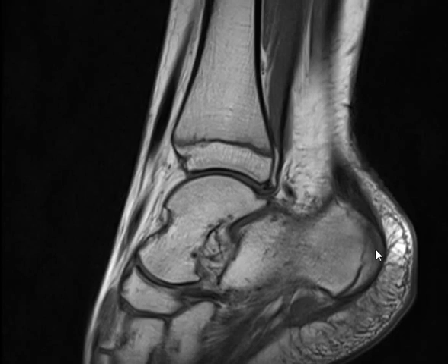And the young lady is healthy. She's sitting in front of me, playing and doing whatever. But she's like crazy. She can't stop for 1 second. She just moves. Hyperactive. So this is a very straightforward case of calcaneal apophysitis or stress fracture of the calcaneal apophysis, whatever you can call it. All she needs is some rest, and that's it. Okay? Thank you.